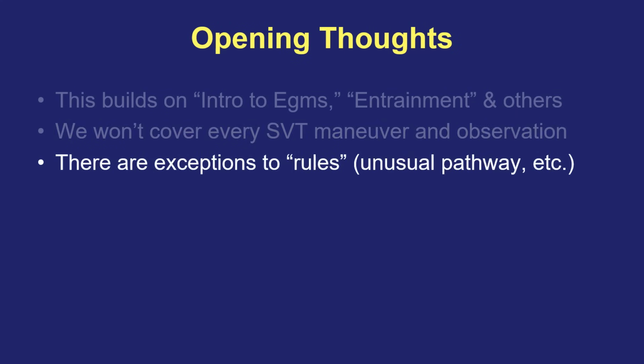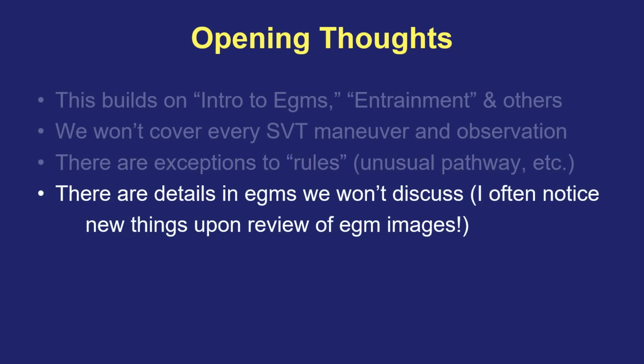Also, there are exceptions to the rules that I will be talking about in this video. So rules I put in quotation marks because every rule has exceptions, especially when we're talking about unusual anatomy or unusual accessory pathways where some of the standard rules and observations that we'll see in most SVT cases may not quite apply. That said, the rules that I'm going to review are going to be true for the vast majority of cases that you'll encounter.